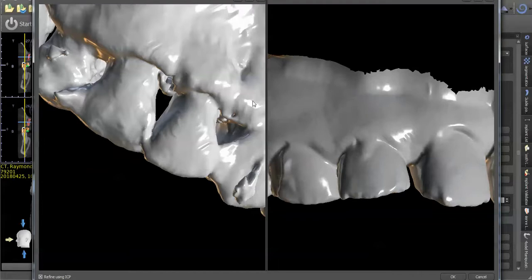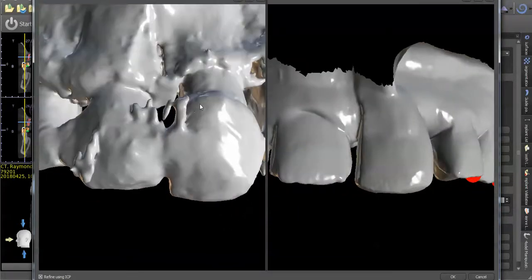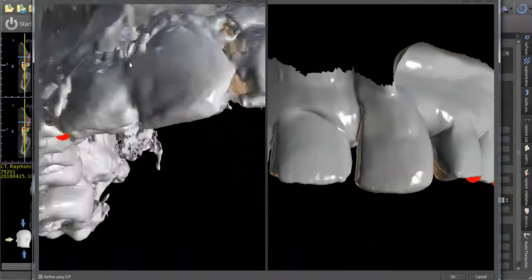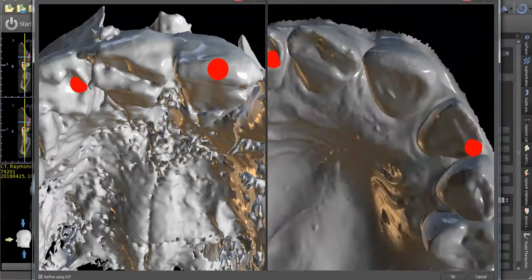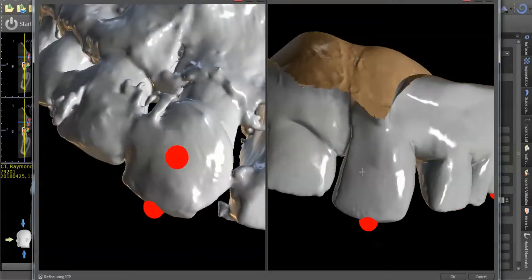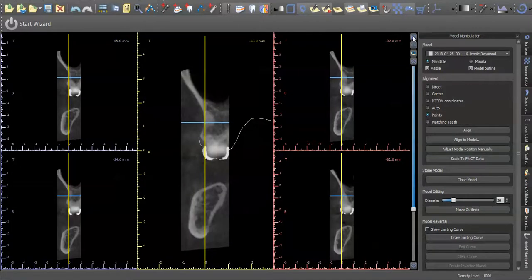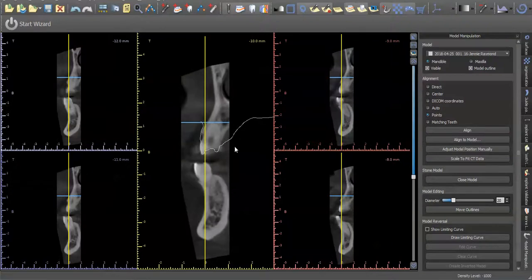It's taking me some time. We can even do something like this just for now, and then go a couple millimeters down. Just try to get some points. Press OK. Now if you go back into this data and start looking at the outline, this looks a lot better as compared to where it was before.